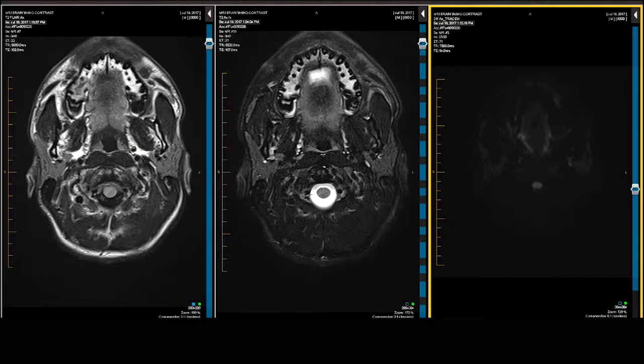And what I do is I generally scroll through these in order to identify the demyelinating plaques in the axial plane initially. As I mentioned, on T2 weighted scanning, demyelinating plaques are better seen in the infratentorial area. So initially, we're going to look at the cerebellum and the brainstem on the T2 weighted scan. And then as we shift to the supratentorial space, the FLAIR scan becomes the dominant, most accurate way of evaluating because of the Virchow-Robin space, perivascular space issue as described previously.